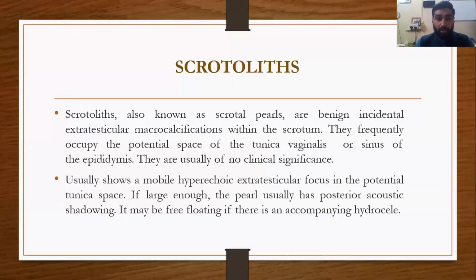Here come the scrotoliths. Scrotoliths are also known as scrotal pearls. They are benign incidental extratesticular macrocalcifications, not microcalcifications, within the scrotum. They frequently occupy the potential space of the tunica vaginalis or the sinus of the epididymis. They are usually of no clinical significance at all.